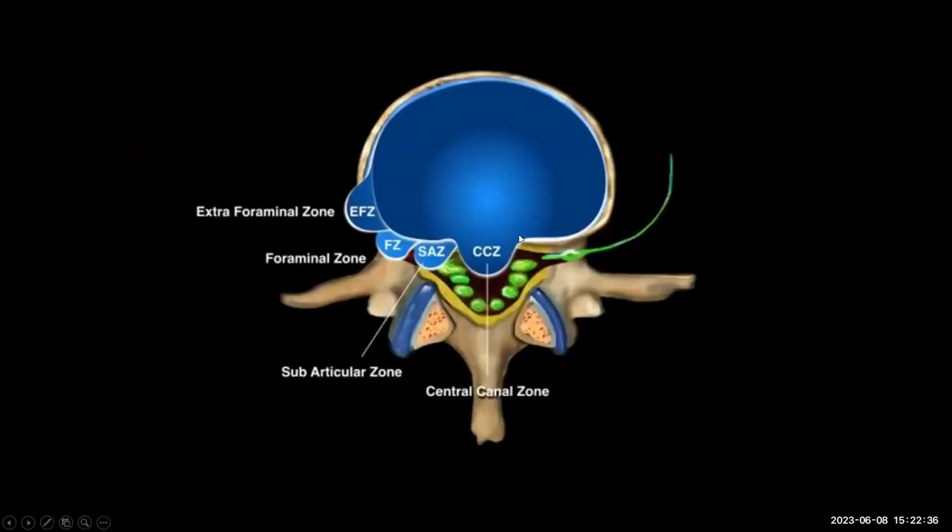Now, when you talk about disc herniations, you have to use the terminology. It could be central. The central discs aren't all that bad because you can see it's quite capacious in the central part of the canal, and you'll have to have a larger disc to actually cause nerve compression, as opposed to some people like to use the term paracentral, although the recommended term is subarticular.